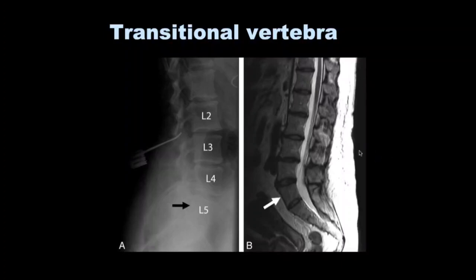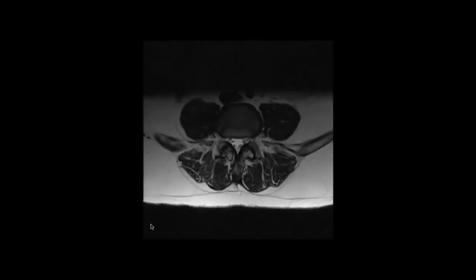I think there's a question about spinal canal stenosis again, which is what we look for: the area, the AP dimension, or subjective. So if you're looking for spinal canal stenosis, such as in this particular example, what you're looking for is that's the dura, that's the CSF within the dura, and there's the nerves which are coming out. And that's the epidural fat. So what you're looking for is, is there enough breathing space for the nerves.